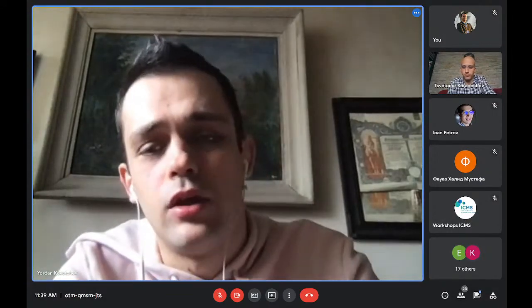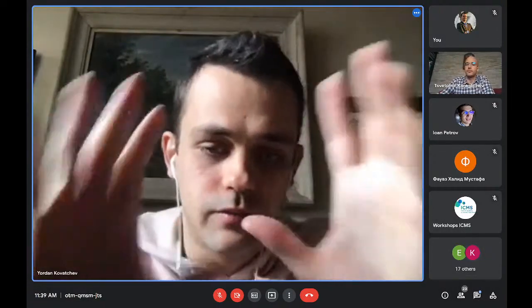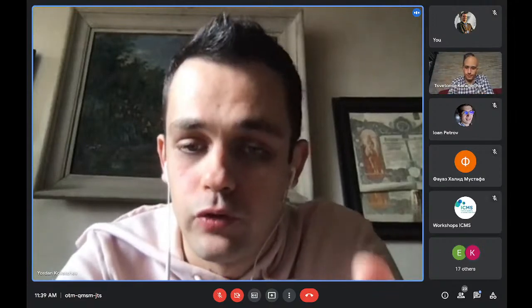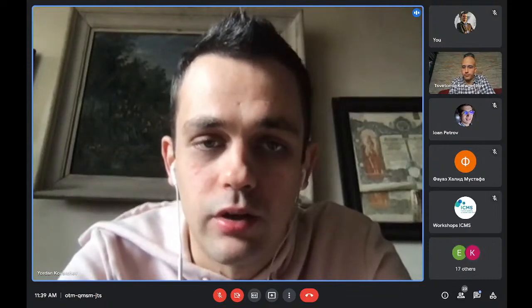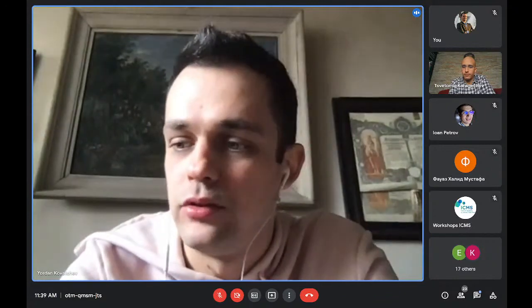Again, in the beginning, I'll do a bit more of anatomy, and not just like in a slide here, but actually how we see it on an actual CT. So whoever wants to do it, I would recommend open this link, and also follow my screen. I'll share now, because you can really get the feel of what it's like to go through a head CT.